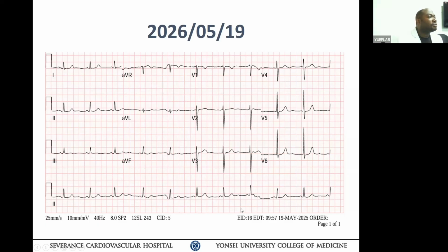So I'm not sure you can conclude U wave alternans here because of the wavy baseline. For you to see the U wave very clearly, you'd better get a good tracing with a stable baseline. Otherwise, you can interpret that I can see the U wave fluctuation there, but is there alternans? I don't think so. The baseline is drifting, that's a problem.